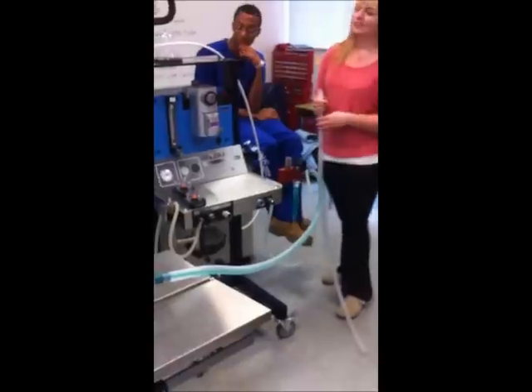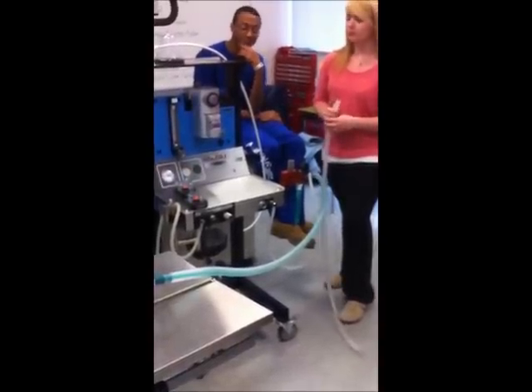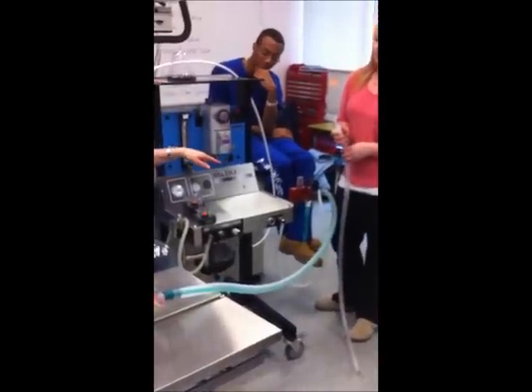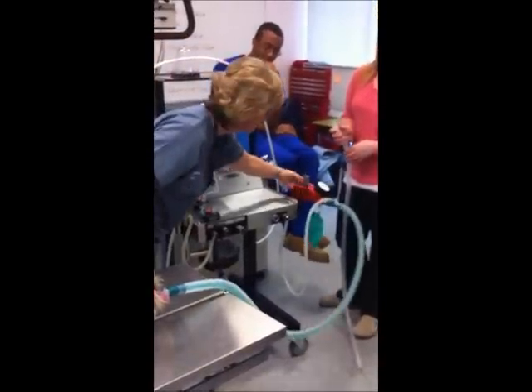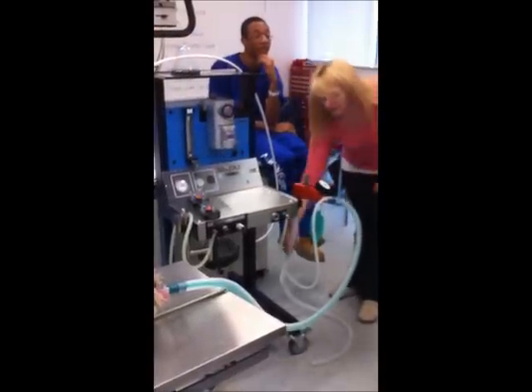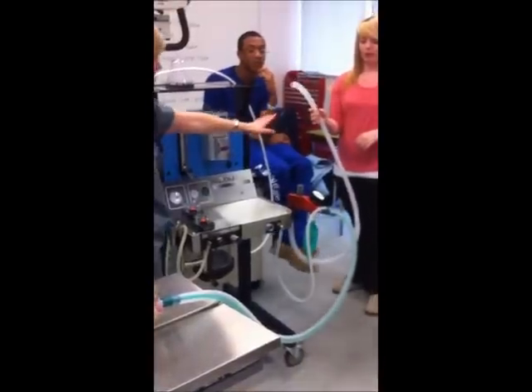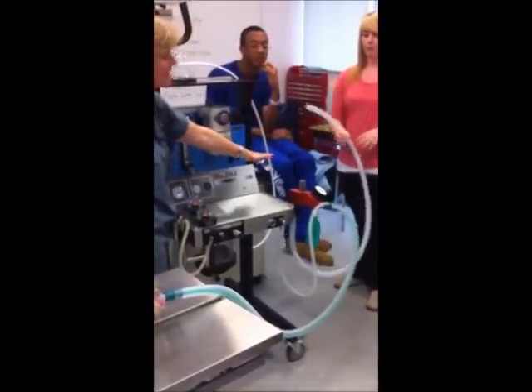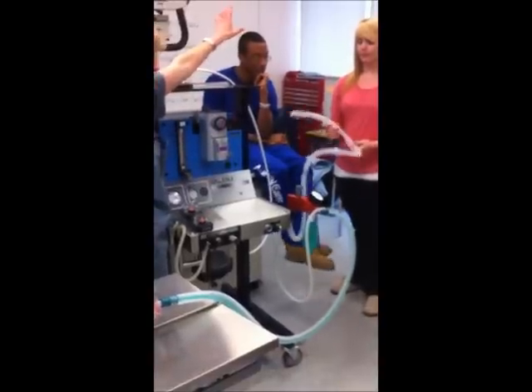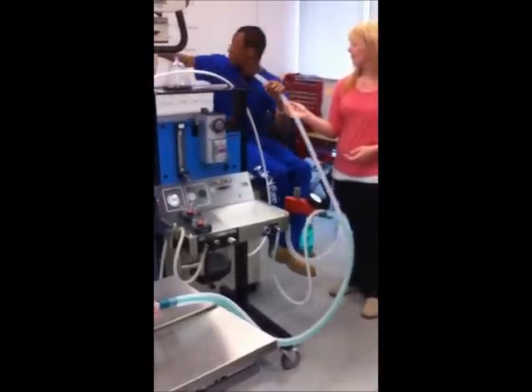They plug it in the back here. So you've got your scavenger and the rebreathing system to the back of this machine. Have a look when you come and look at the machine. And in my non-rebreathing system, it's right here. Okay, so yeah. That's probably one of the mistakes I made. Now, in terms of the non-rebreathing, students tend to want to do something with this hose. You can just lay it down, but know that normally the scavenge is hooked into the wall and it's pulled out to the outside.